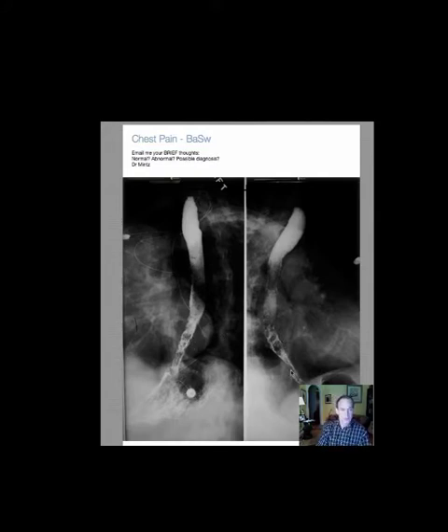They could be small masses. This could be an infectious esophagitis. This could be a reflux esophagitis, maybe with the early development of Barrett's esophagus that potentially is even starting to create pre-malignant changes.